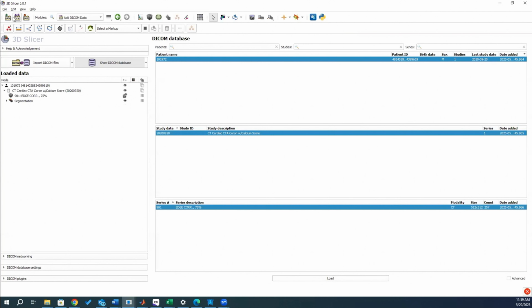We're all finished with our segmentation for the CCTA, so we're going to go back to our DICOM data with the purple arrows. Before I close out, I want to export the images. I'm going to edit the name of the images to match what I segmented. Segment 1 was the RCA. Segment 2 was the LAD. And segment 3 was the LCX.